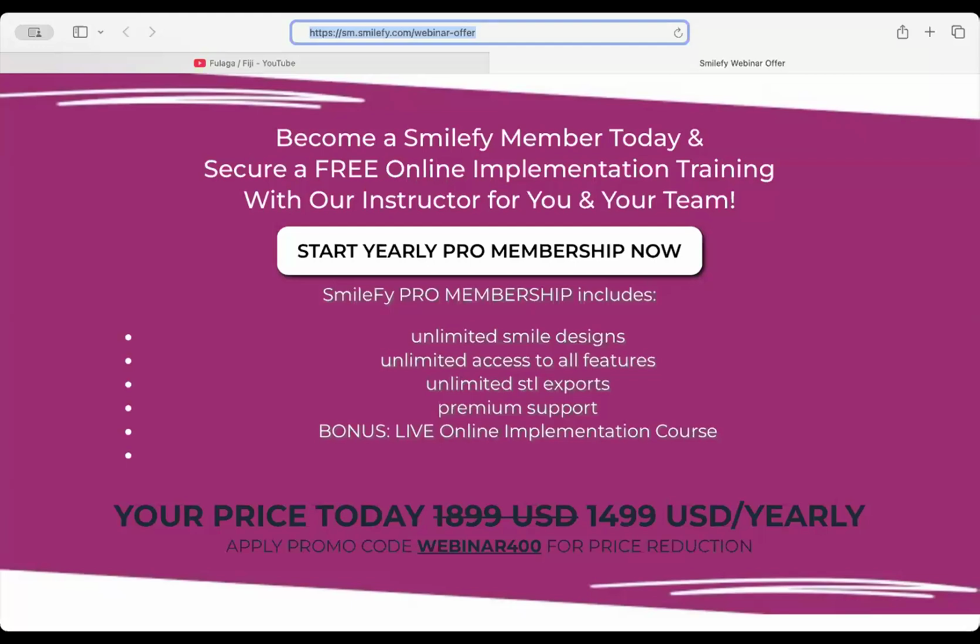Do you have an option for only STL model export? No, it's STL and OBJ. We export OBJs and you can print. Our projects are open, so whatever you design, you can export. You have access to all files, and then you can print and export.